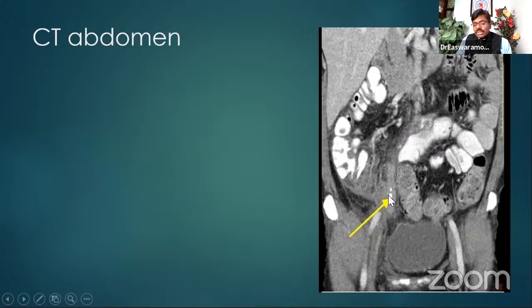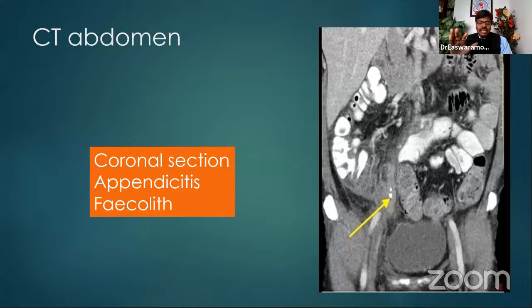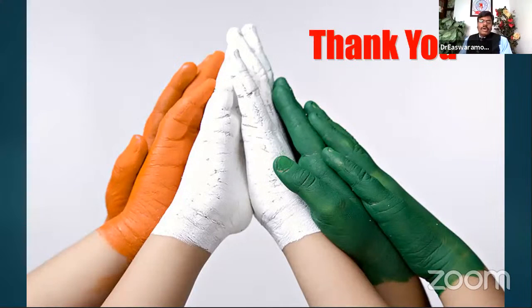There you can see a couple of radiodense opacities very clearly, a classical presentation of appendicolith or a fecalith in the inflamed appendix with a periappendicular phlegmon. Phlegmon is an inflammatory reaction around the appendix. So these are the CT findings. In other words, I keep telling you, from today onwards for the next few weeks, you keep seeing various X-rays, hear various radiologists describe, start to speak the language of the radiologist, then think like a surgeon and read like a radiologist, then you'll be a master of radiology.